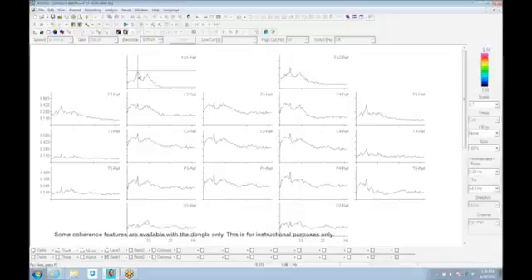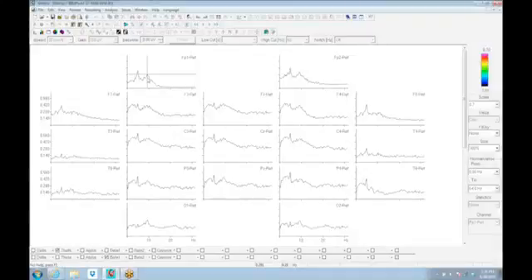So this is that slower content. Here's the alpha at 0.291 coherence. And these coherence ranges are within the normal functional range of raw coherence. Again, for hypercoherence, you've got to start to stick up above 0.5 or so, and hypocoherence is down below 0.1. So in general, the coherences here are within a normal functional range. Not too hot, not too cold, just kind of the normal amount of connectivity.